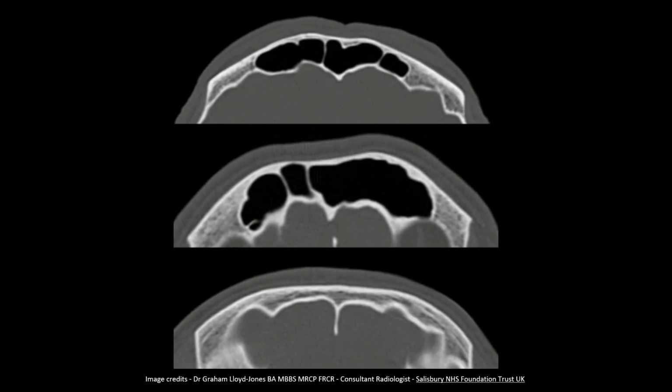Okay, so as I said earlier, the frontal sinus is unique to the individual, and so don't be taken aback if you see varied patterns of the frontal sinus. If you see here, we have multiple septations within the frontal sinus. You have three cavities here, and there's a huge cavity over here. So the pattern varies, and as I said earlier, in the case of my sister and around 5% of the adult population, the frontal sinus does not generate. That's called a frontal sinus agenesis.